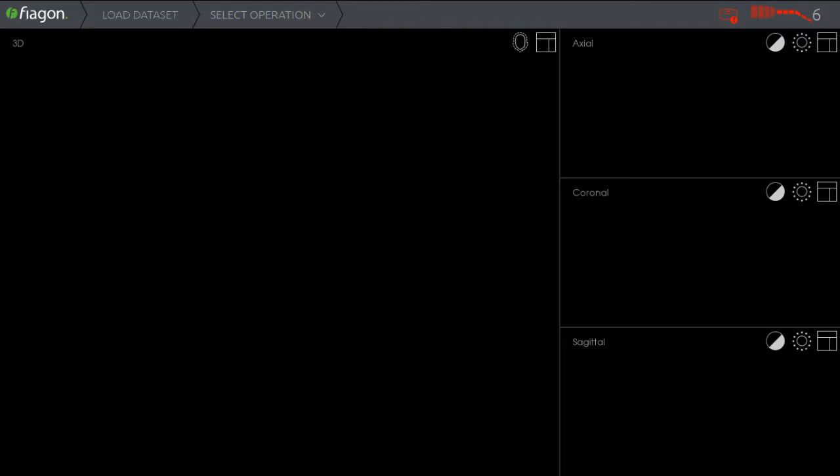Once the navigation system has fully started, the opening navigation screen should be displayed. The navigation screen will consist of 4 sections where patient scan information will be displayed. Typically, these sections will consist of sagittal, axial, and coronal patient scan data. The 4th screen will either display a 3D model of the patient data or can also be used to display a live video input source such as a surgical endoscope, which must be clicked to activate.